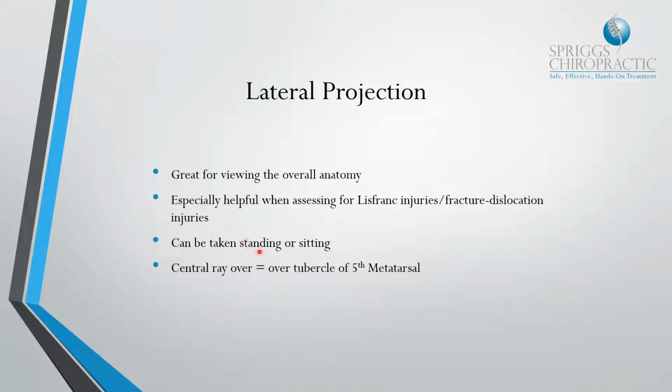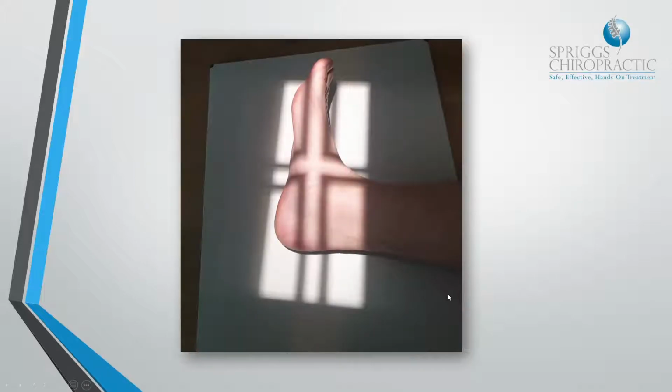Whereas if you're looking for more of a degenerative process and the patient is ambulatory, we're not taking the projections as a result of trauma series, then you can have the patient standing for these projections as well. And the central ray is over the tubercle of the 5th metatarsal.